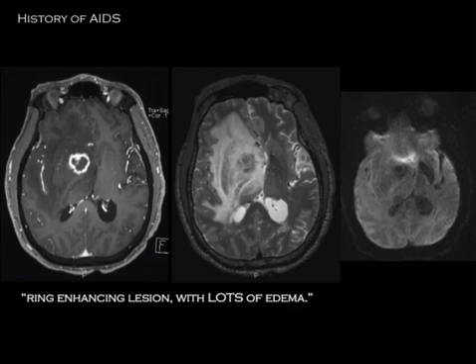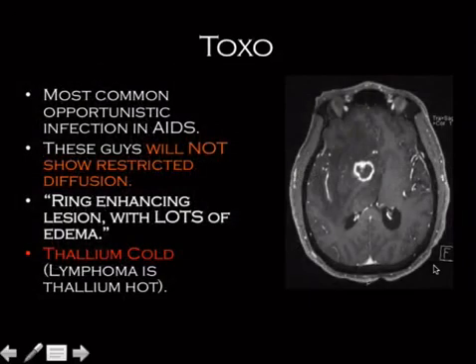You may get tricked, and this would be the reason to show diffusion on multiple choice, to try to trick you into thinking, oh, it's not an abscess because abscesses have to restrict. Wrong. Bacterial abscesses restrict. Fungal abscesses or atypical infections don't have to. So this is toxo, and those are the three main things to know. Toxo, it's typically ring enhancing, person with AIDS, way too much edema based on the size of the lesion, does not have to restrict diffusion.